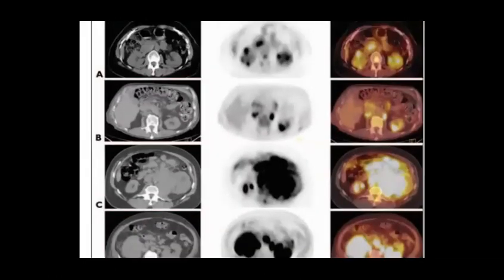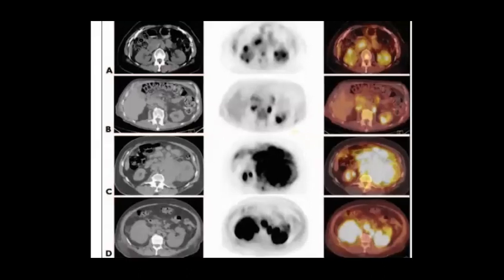If someone wants to talk, he can talk, sure. We like either text discussion or voice discussion. So what happened here? Again, with this patient we can take it easy now. It's lymphoma, perfect. So what happened with lymphoma here? Let's start with this A, which is one patient, and this B, another patient, third patient, fourth patient. Let's go with this one, and you can describe the uptake.